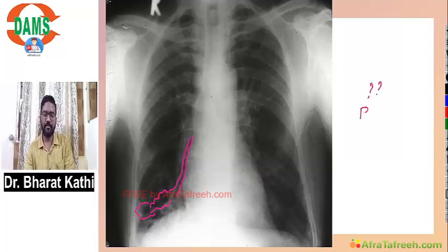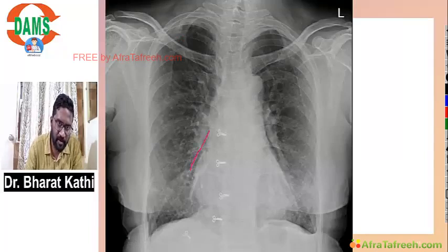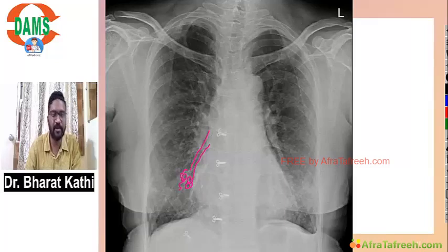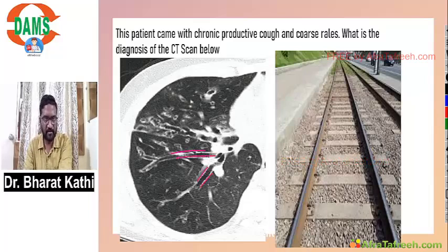So this can be bronchiectasis. And same thing here also you can notice, this bronchus is abnormally visible, and you can see some cystic areas. So again, this is bronchiectasis, and these findings can be seen very well on a CT scan. So what are these findings called as?